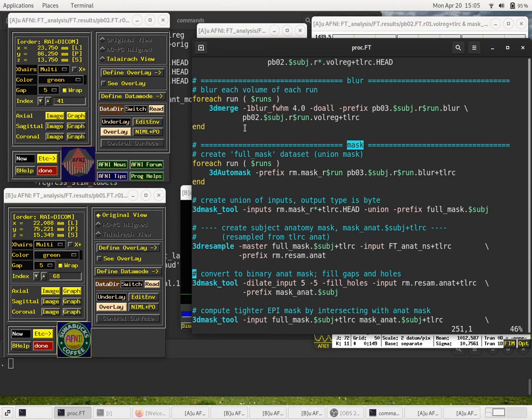So imagine, for example, along the cortex, someplace you locally have 4 folds in one subject and 3 folds in another subject, and those can't possibly register perfectly. So another reason to blur is so that each single subject's blob, say a statistical cluster, if you blur it a bit, can be a little bigger, and then they will overlap better at the group level. So let's just see the effect here.